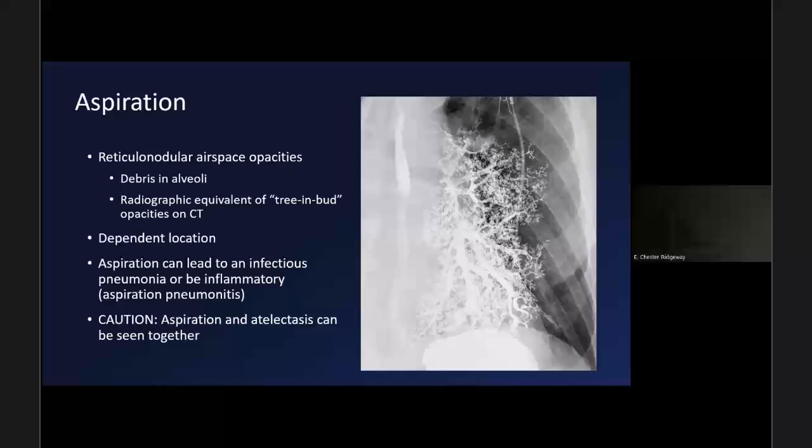So I really love this image, as unfortunate as it was to the patient. They were doing an esophagram and had a massive aspiration. So we can see the airways beautifully. Stunning image. Super unfortunate event though.